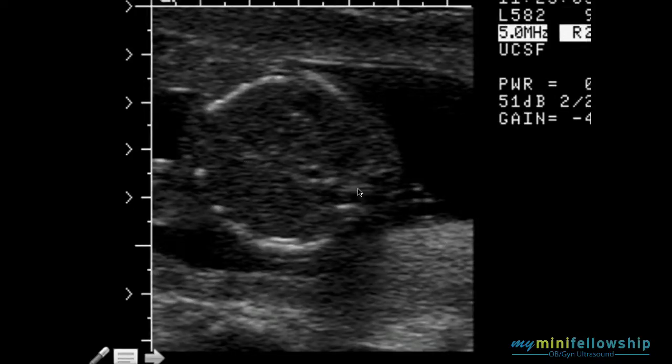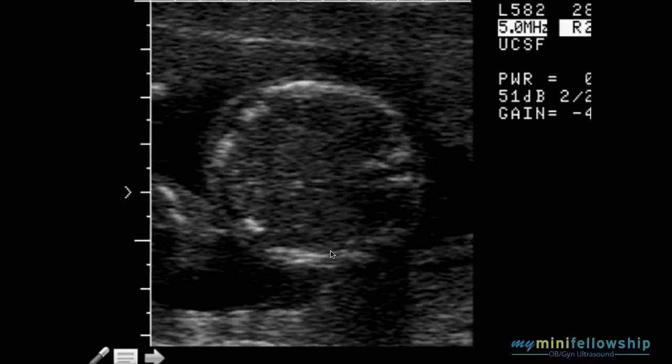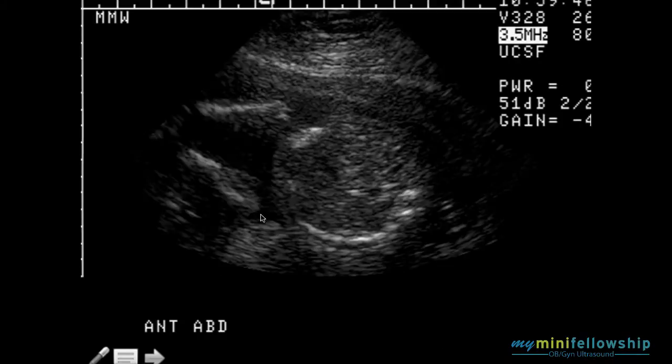We again see the spine, the aorta. Here is a rib. And you'll notice that this thing goes too far anteriorly to possibly be a rib. Right. You can see some of the stomach. And you can see that if this continues on course, it will pass under the rib. Okay. A couple additional dots. Here is a rib. Similarly here, spine, rib. These are too far anterior to be ribs. And the same thing here.